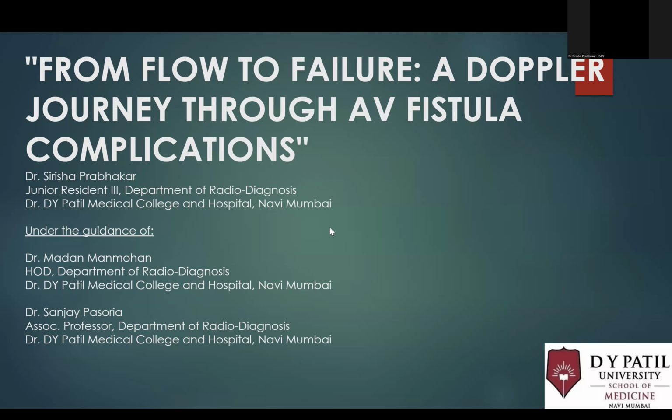Today I'll be taking you on a diagnostic journey through arteriovenous fistula complications in hemodialysis patients using Doppler ultrasound. We'll explore 8 fascinating cases that highlight why early detection is crucial for our dialysis patients.